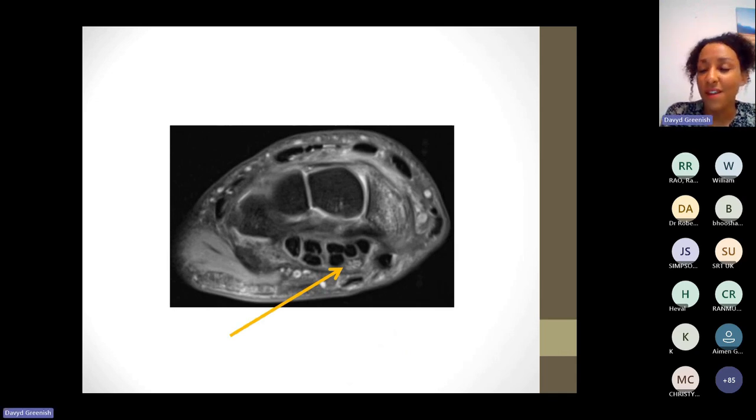Now that nerve, if anyone knows which nerve I'm pointing to, a lot of us know in theory, or some of us will know in theory what goes through the carpal tunnel, but it's very different when you actually see these structures. So this is the median nerve. So we've seen it in the chat. You guys are smashing it.